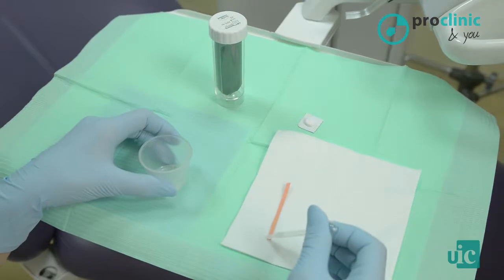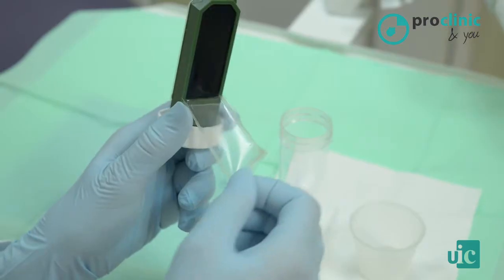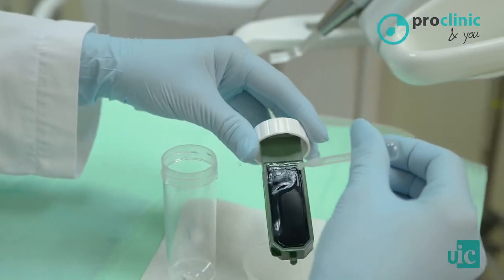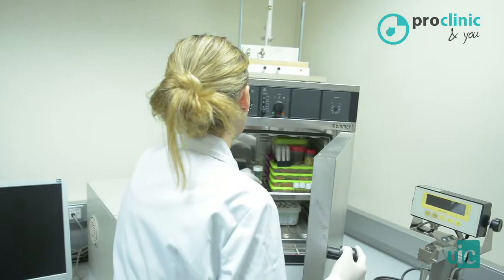The kit provides two culture media, one for Streptococcus mutans and the other for Lactobacilli, which can be impregnated with 3 droplets of saliva. We introduce them in the pipe that we have in the kit, and we take it to the incubator. It will remain in the incubator for 48 hours at 37 degrees. Once 48 hours have passed, you can extract it and proceed with the interpretation of the results.